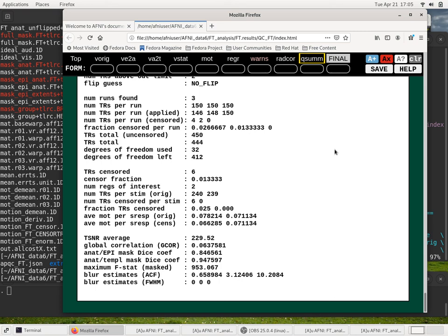This is supposed to be a start to finish, so I'll do that for the finish aspect, and I'll go through the global processing outline as well, which, at the boot camps at NIH and wherever, we would describe the actual processing steps that we'd run for a complete analysis. Not looking at the data so much like this, but just an outline of all the steps. So we'll get to that in a little bit.